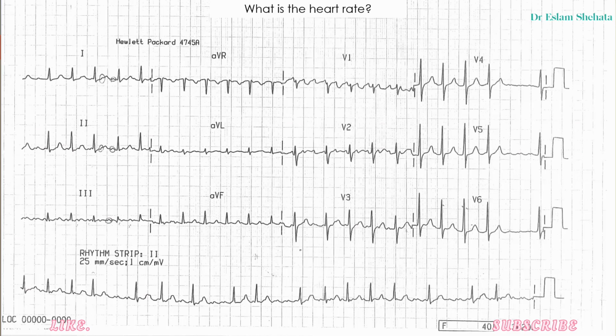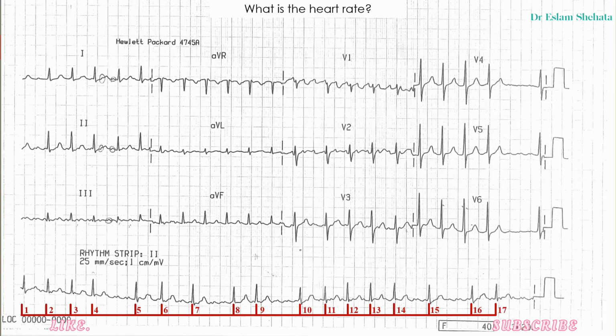Now in this ECG here, I'd say it's still definitely easier to count the QRS complexes along the rhythm strip. And that gives you 17. 6 times 17 is 102. Okay, rate's 102. However, as you can see, this ECG is quite irregular.